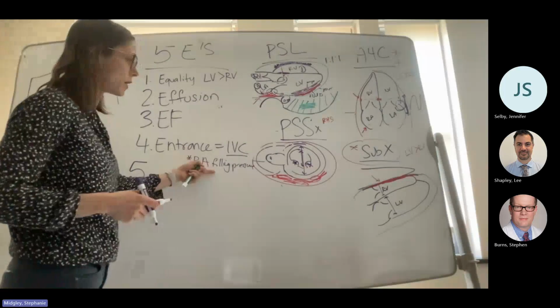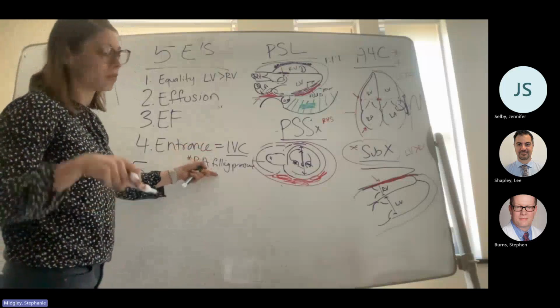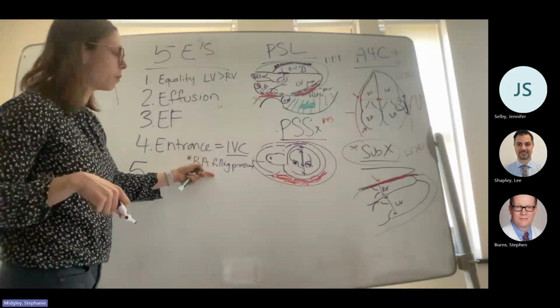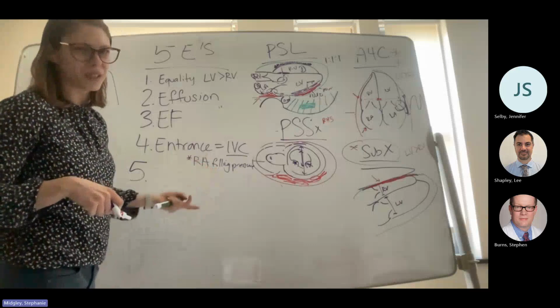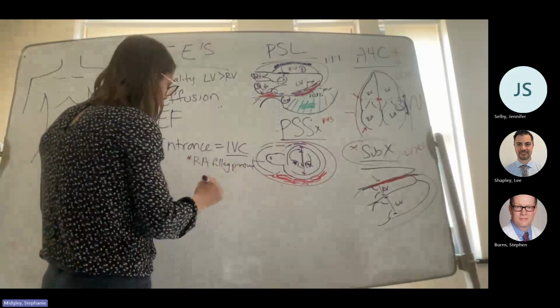Whereas if you have somebody who has right-sided heart failure and really bad tricuspid regurg, they could be volume down and dry, but have a really big IVC just because the right side doesn't work very well. So it's more a reflector, not a volume status.